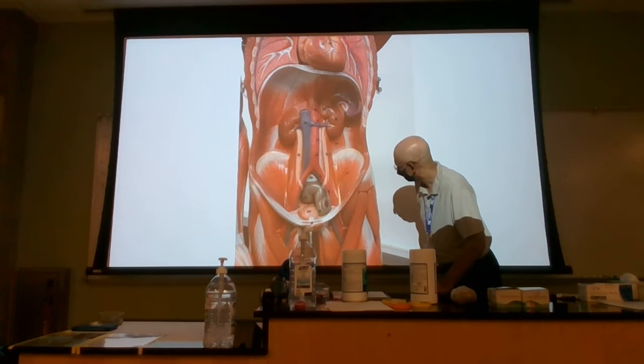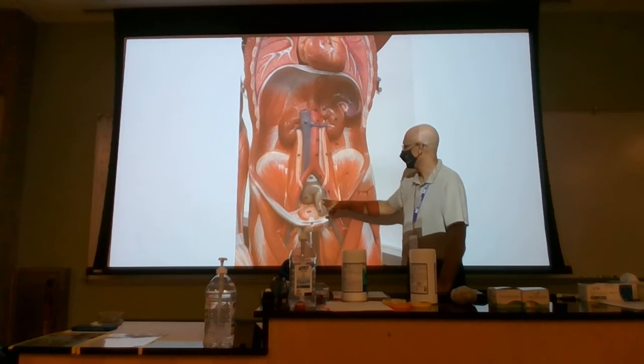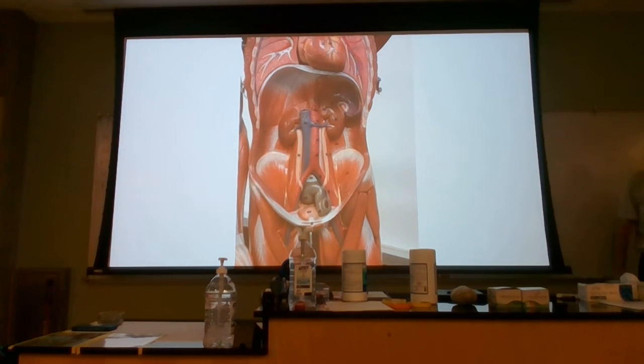I'm trying to look for the... You cannot see the internal, external very well. You cannot see the branches of the internal, right? So you cannot see the internal and external iliac nicely on this model.